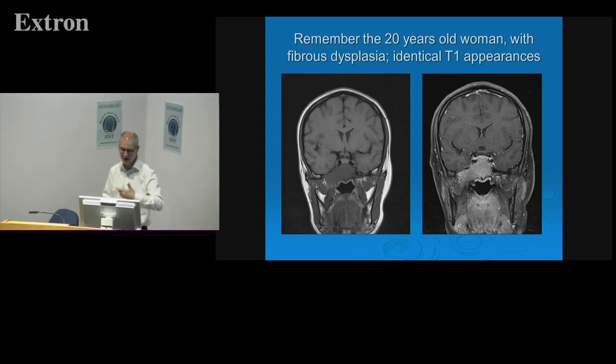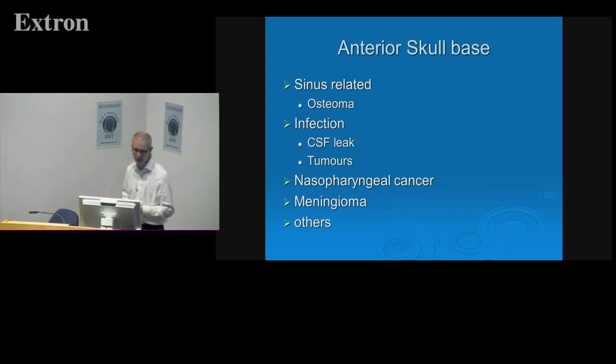And just for comparison, really, you can see that patient with the fibrous dysplasia again. These have a tendency to get over-reported, and they happen not every year. We get one or two of these. It's sent into the MDT where people have queried high-grade tumours, and obviously it turns out not to be. Okay, moving on then.